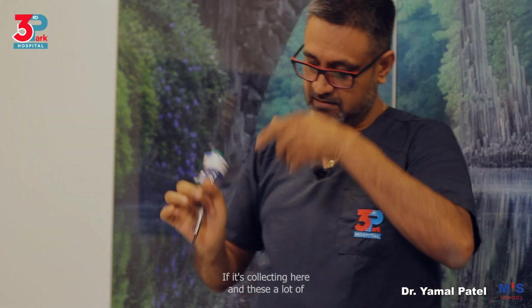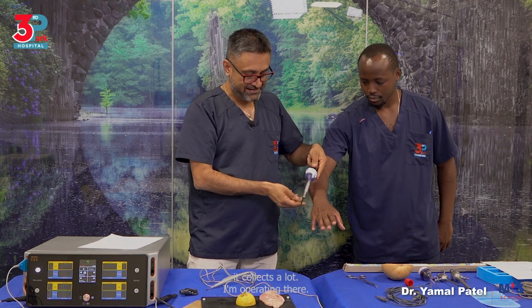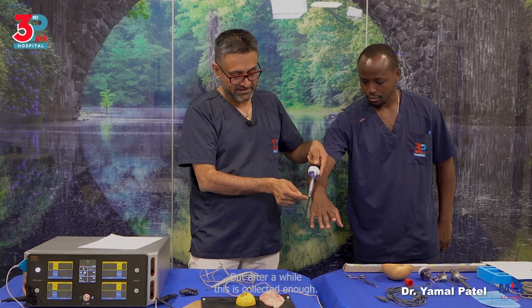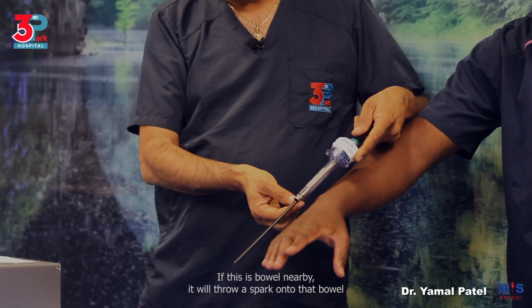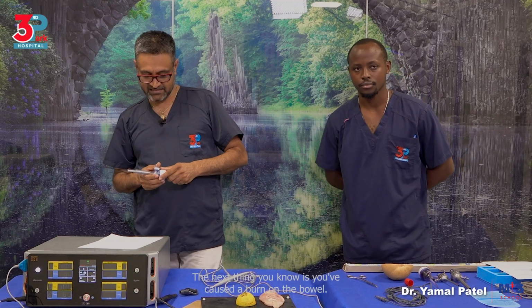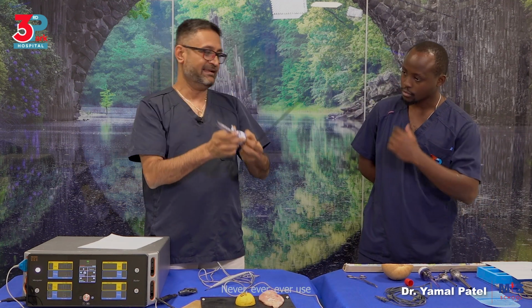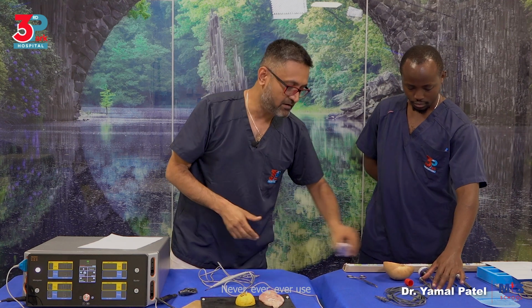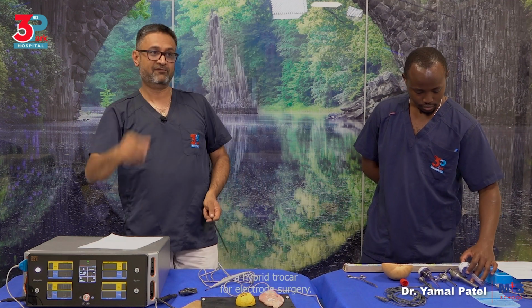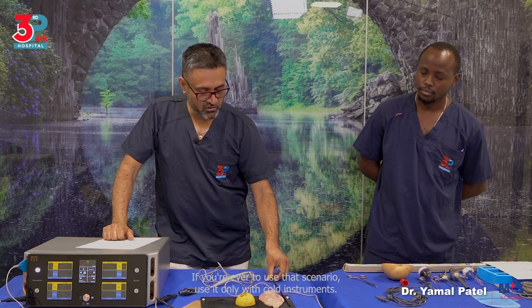If it's collecting here and it collects a lot, I'm operating there, but after a while this has collected enough. If this is bowel nearby, it will throw a spark onto that bowel. And when it throws a spark onto that bowel, the next thing you know is you've caused a burn on the bowel. End of story. So this is called a hybrid trocar. Never, ever, ever use a hybrid trocar for electrosurgery. Okay? If you are ever to use that scenario, use it only with cold instruments.